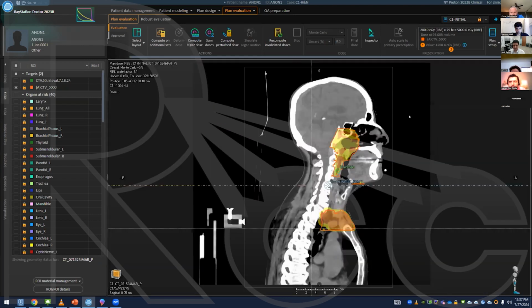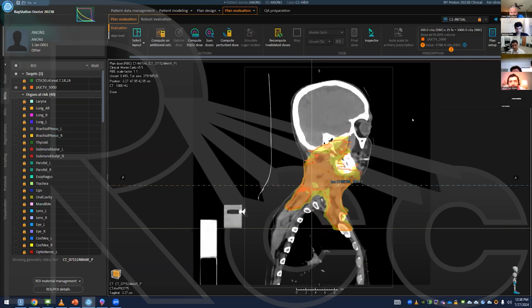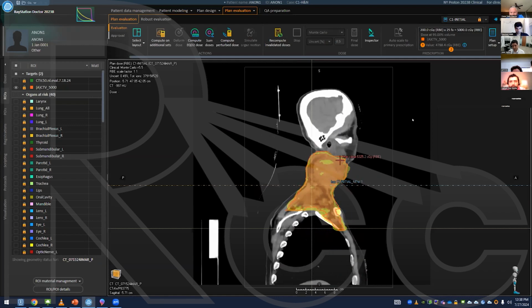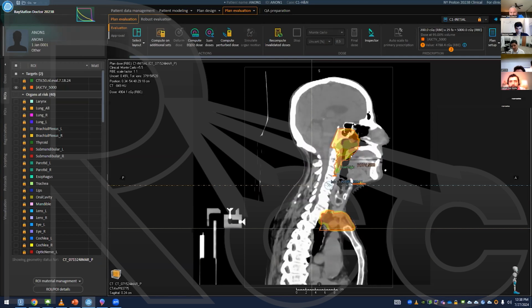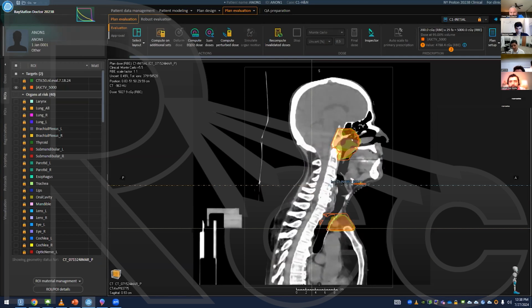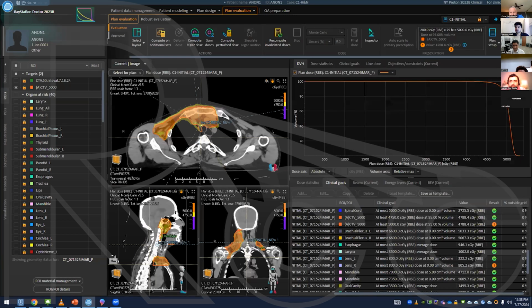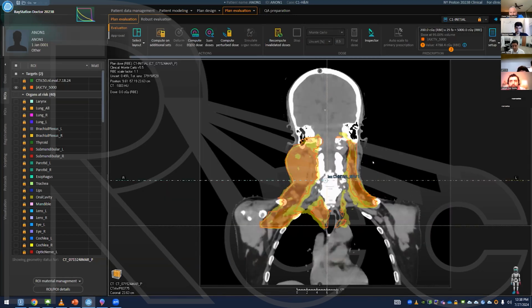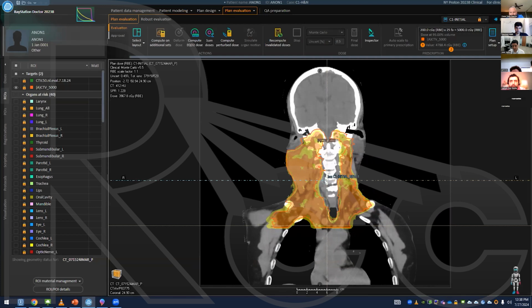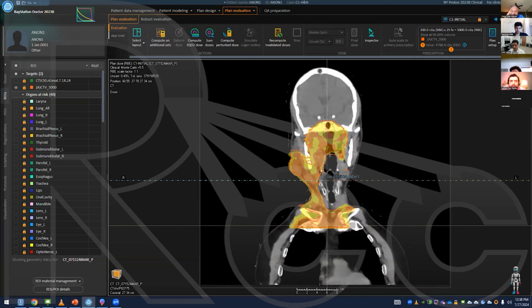And as Dr. Malik said, we're going to take a look across all three views just to make sure everything makes sense. All the important structures are well covered. Again, as Dr. Malik said, you want to look at the soft palate involvement and all of that. Make sure your field has gone superiorly enough into the sphenoid sinus. And coronally as well. It helps you to evaluate the skull base coverage. So this is excellent. It's pretty good. It's going pretty lateral. So pretty happy with that.